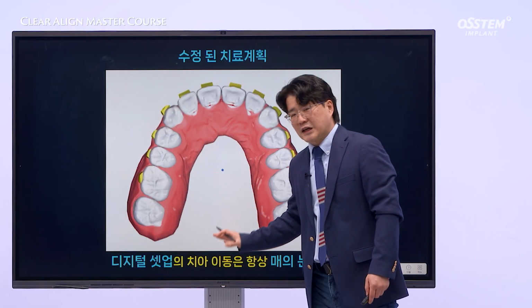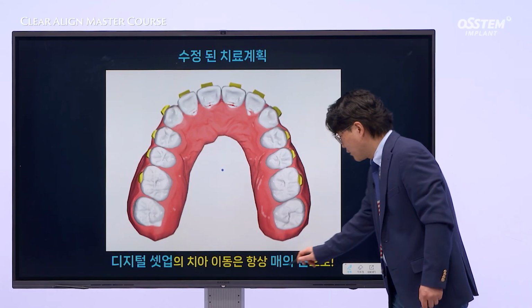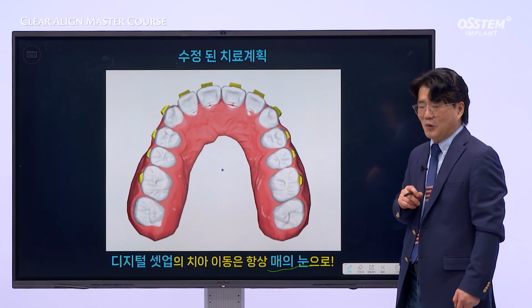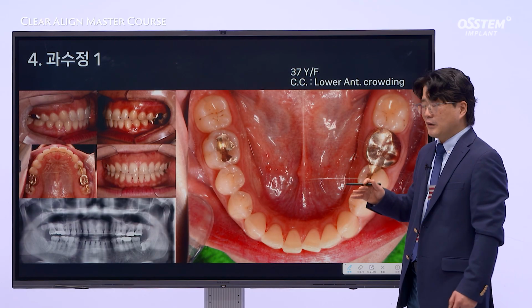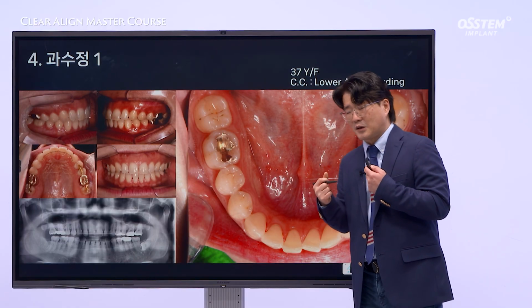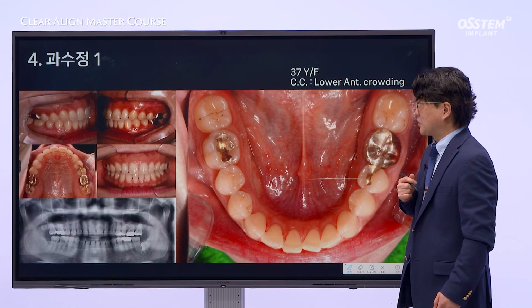When you review the tooth movements in digital setup protocol, it's important to observe everything carefully, like a hawk. Make sure to evaluate whether the movements were reasonable and communicate with the designers when in doubt. Only after that should you click the Approve button.